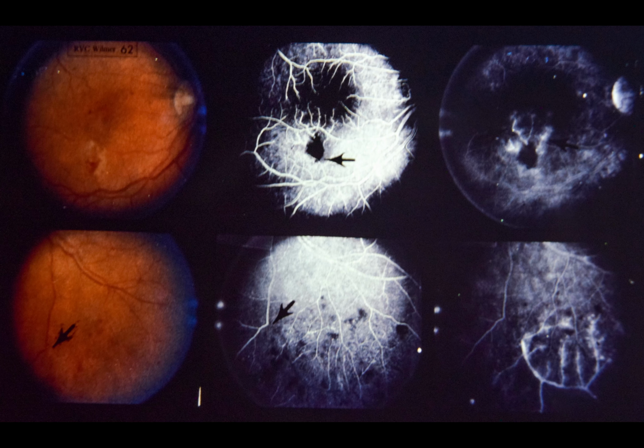Comment: this patient demonstrates bilateral retinal venous obstruction with retinal hemorrhages, capillary closure, staining of vessel walls, and leakage from vessels presumably damaged by hypoxia. There was no anterior segment inflammation, and the systemic evaluation was entirely normal.